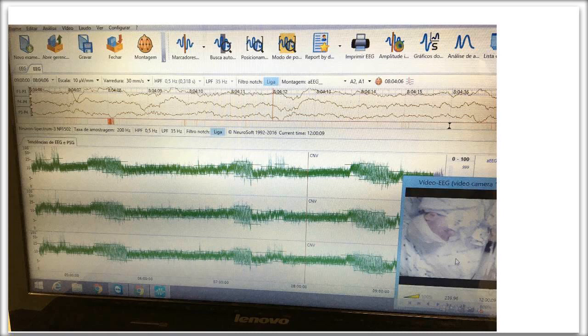I usually see this more heightened pattern when they're closer to 44, 45 weeks, at which point you start to see the alternating patterns kind of disappear as they transition into a different sleep pattern at around 44 weeks.